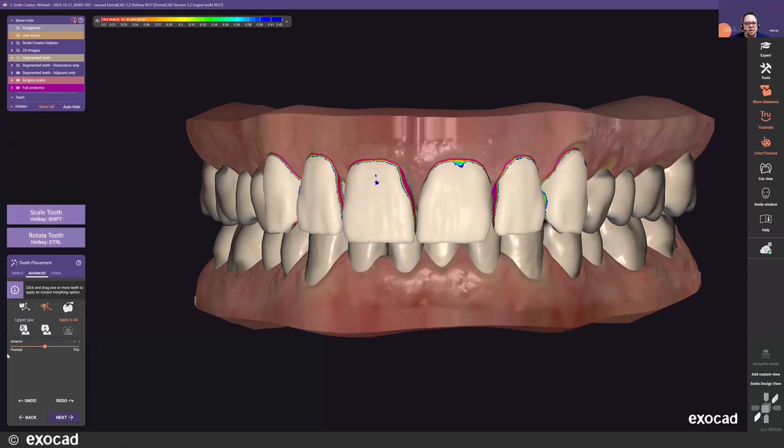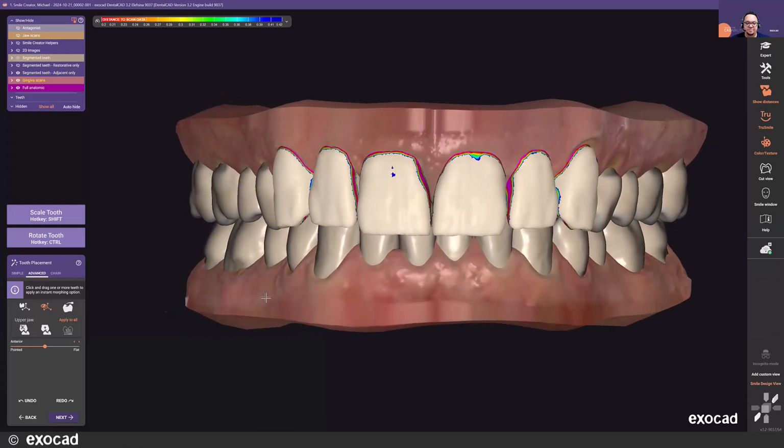And then there are slide bars to adjust your incisal edges from pointed to flat as well. So if you want to adjust the library itself, I'm a big fan of these to where you can really get multiple libraries, with the option of this slide bar. You're adapting that whole library to change the visualization and the aesthetics of the incisal edge at that point.